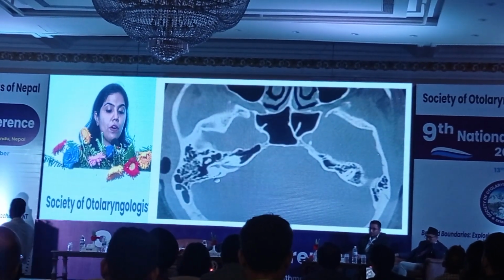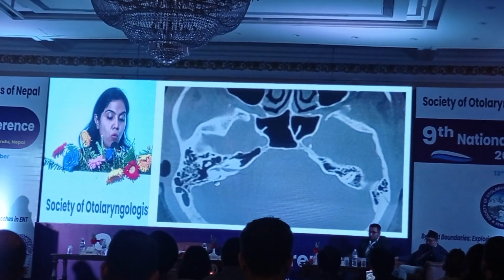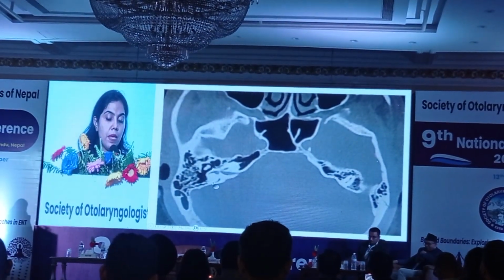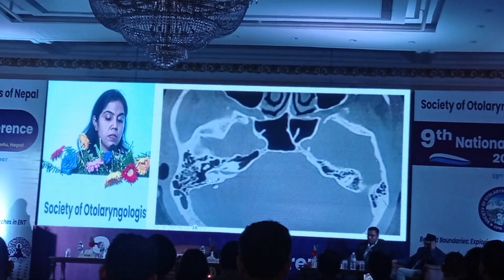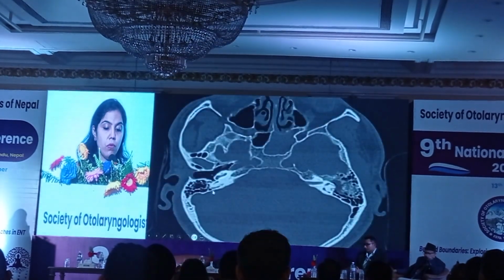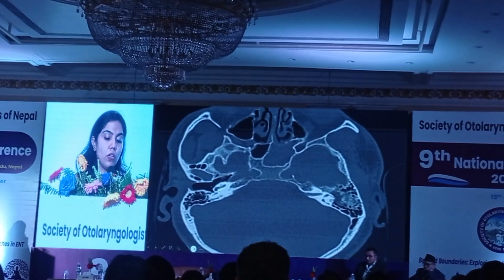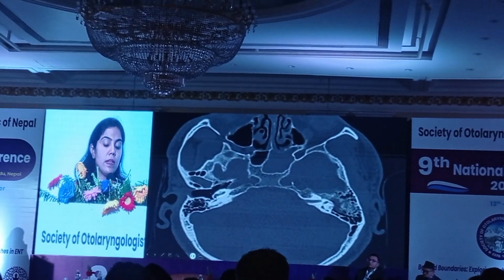As I go further in the axial scans, I come more laterally. I will be able to see the proper signet ring of the lateral semicircular canal, and this is the appearance of the smiley sign of the cochlea, and this point is my round window.